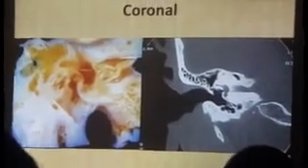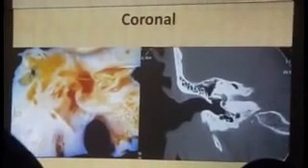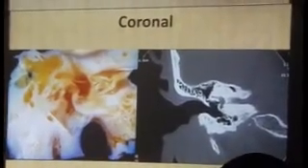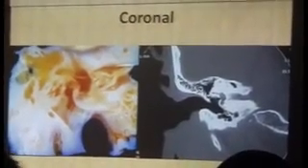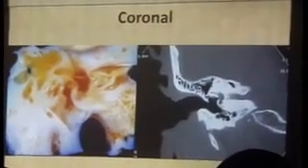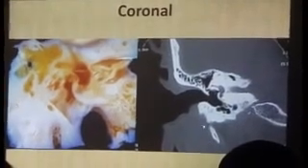Now this is one of the posterior scans, and I wouldn't say this is the most posterior scan because you're not seeing the posterior canal here. That is what you would normally see on the more posterior scans, but as I mentioned, this presentation is more about the ossicles. So as the ossicles start getting visible on the coronal section, what do we see first?